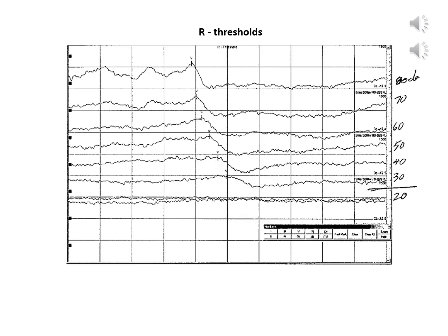This is the threshold recording for the right ear. And so again, in the top tracing, we see a 1, 3, and 5. And then as the stimulation intensity decreases, we'll notice that the 1 and 3 get smaller and smaller, and then the wave 5 also gets smaller and later. And in this ear, we can track the wave 5 getting smaller and later. It's well marked on the image until about 30 decibels. And by 20 decibels, the tracing is entirely flat. There is no wave 5. And so the hearing threshold here is 30 dB.